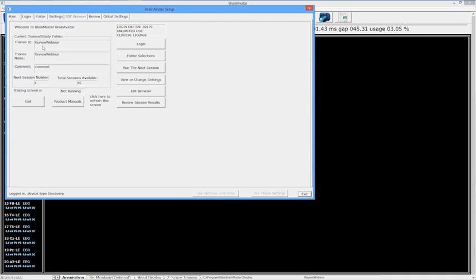So now, as you can see, I have a file called Review Webinar that I created, a folder. And I will recommend, usually for reviewing and things like that, you might want to make yourself a special folder like this. The nice thing about creating a folder that's set up with your settings is you're going to be able to review what you want to see. If you want to look at Z-scores, you can have them set up ahead of time. If you want to review the Live Loretta projector or S-Loretta Z-scores, you can have those things set up outside of where you did your QEEG or anything of that nature.